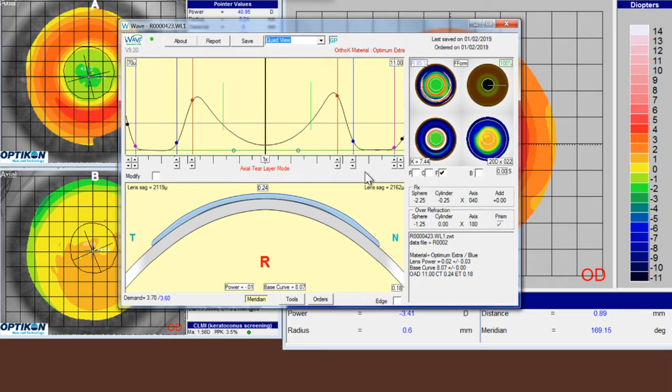If we want to target the full 2 diopters, right now we can use the power as our gauge. We're at 0, so if we steepen the base curve 2 diopters, then we would expect the new lens power to be about minus 2. And I'll do this in 8x mode. We're going to click down at the red dot. And we're pretty close. And now we're about 2 diopters steeper than the prior lens.